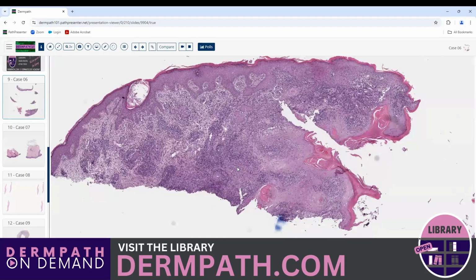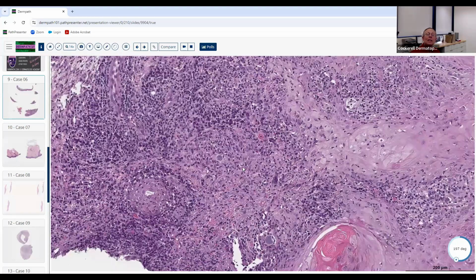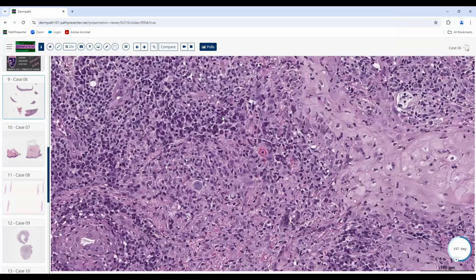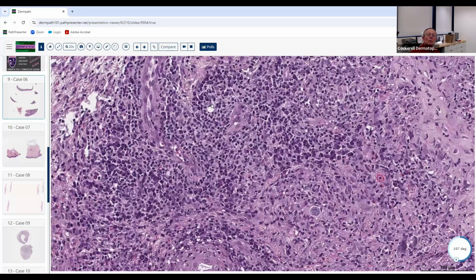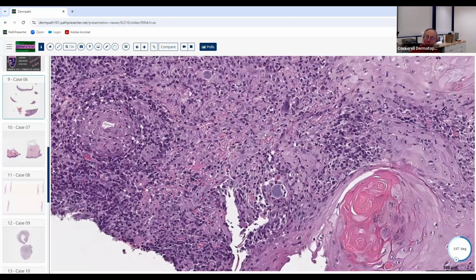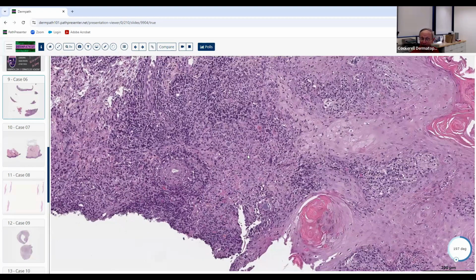What about here? Is that a little granuloma? Yeah, there's a big area. Whenever histiocytes predominate in an area, we call that granulomatous inflammation. And when we see neutrophils plus histiocytes like that, what do we call that? There are some neutrophils in here too. We call that suppurative granulomatous inflammation. Which is seen very commonly in what kind of settings?